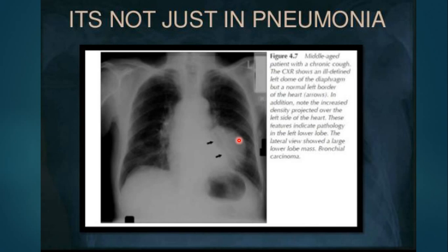One of our colleagues has also commented that intermediate bronchus pathology can affect the right middle and lower lung lobes. If there is bronchus intermedius pathology, it will affect both the middle and lower lung zones. So if we have silhouetting of the right heart border and the right hemidiaphragm, intermediate bronchus pathology should also be considered in addition to pleural effusion.